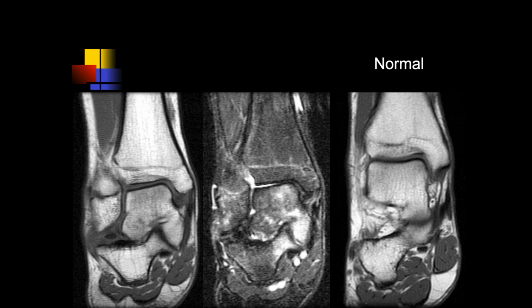So we'll go ahead and start off here where we left off before. I think the last case we looked at was this case where we saw a lot of bone edema here. But what you notice here is that the subtalar joint is abnormally configured in the middle facet. Instead of being horizontal like is normal, it's obliqued, and therefore the force transfers through the subtalar joint space are abnormal, and we're getting these trabecular bone injuries, which can be painful.